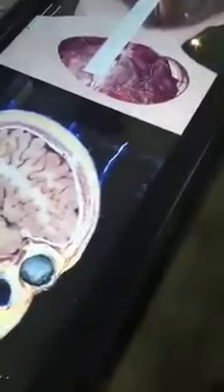So everything you see here is what we saw at 0.6 to 0.8 millimeter thickness. And so each time I turn around, slide through these sections, I can see the anatomy. You're not just limited to the head and neck, you also have areas like the brain, large areas like the thorax and the abdomen, all the way down to the leg and foot.